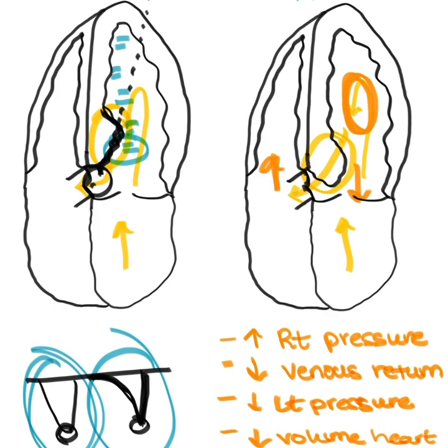You start to get a higher ejection fraction, meaning that this velocity here is going to be much higher now because you have a harder squeeze, you have a higher velocity. So instead of this hitting around 2 meters a second, now it's going to extend all the way down here, and it might give you 3.5, 4 meters a second. So it's just going to exaggerate this waveform and tell you the worst possible scenario of what this patient could endure.